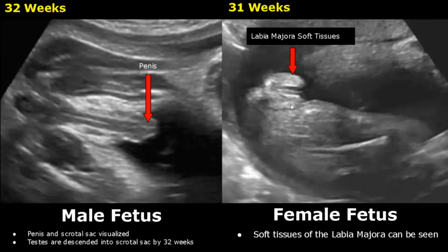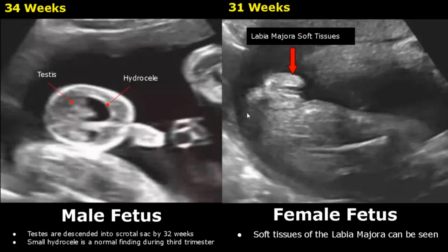And over here we have a female fetus of 31 weeks. We can see the soft tissues of the labia as well, along with the hyperechoic lines. This is an image of a 34 weeks old male fetus, and we can see the testes within the scrotal sac. Also there is some fluid outside the testes, the hydroceles. In the third trimester, such hydroceles are a normal finding.